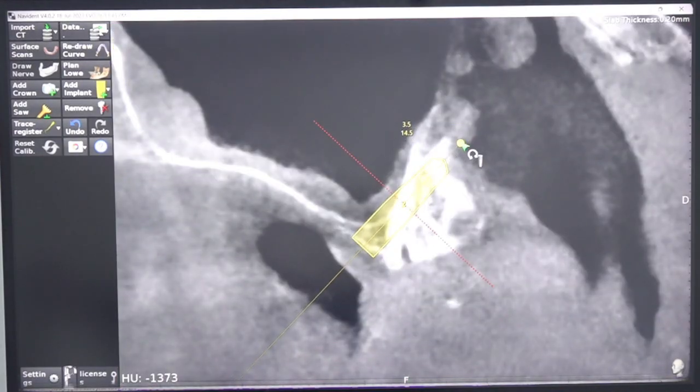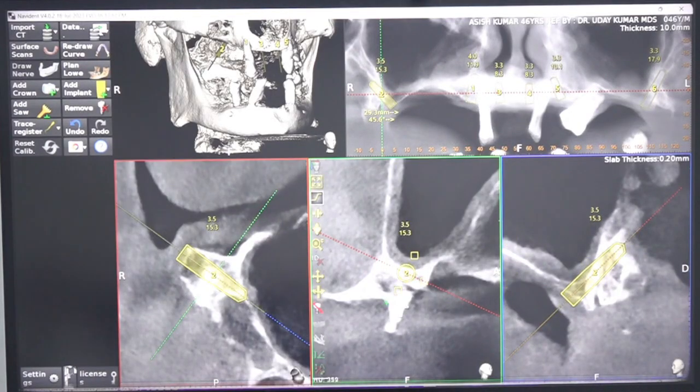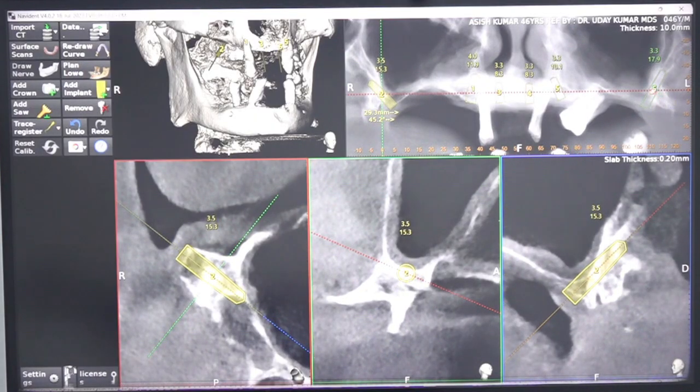Okay, if I am placing a 2-piece implant, I will place either a 3.5 Neodent or a 4 mm JD pterygoid. Okay, both are okay. If I am selecting CMU implants, that is also a good option. I will select a 3.7 or 4.2 diameter implant, 15 or 16 mm length, with a 30-degree multi-unit angulation, inbuilt angulation is there. So this is the plan for the right pterygoid. We will see the left pterygoid now.